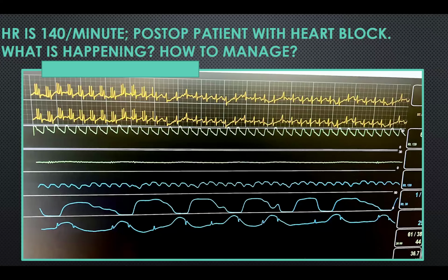So again, basically you're right, but you're wrong. So you're right. The pacing spikes seem to go away, and yet the heart rate stays pretty much exactly the same. The blood pressure remains exactly the same. And basically, this is an example of how the pacemaker modality on the monitor can fail you sometimes. You had suggested, Ivana, that the pacing modality was essentially turned off, but it wasn't actually.